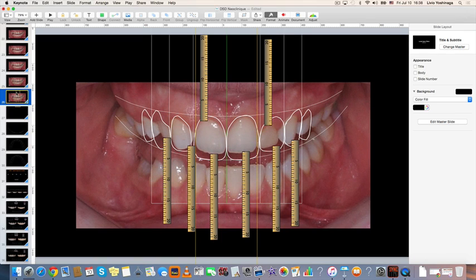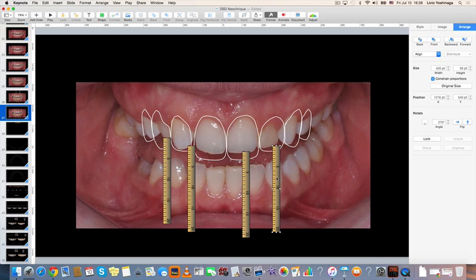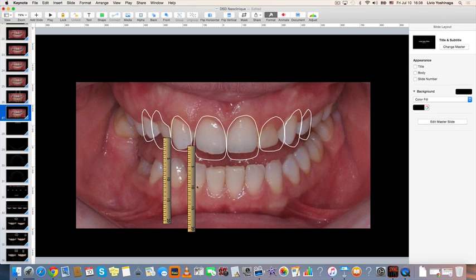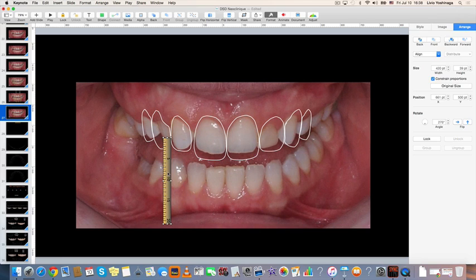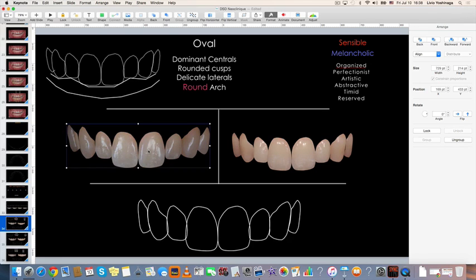Next step, we're going to erase everything. Erase everything here. I don't need my auxiliary lines. And we're going to paint this outline with real colors. So you've seen how we can paint with her own color. Okay. And we can also paint with the original colors here.